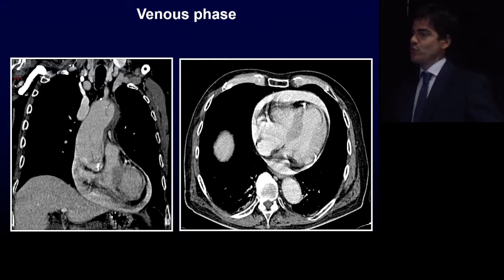just because I was reviewing pericardial disease, et cetera, and it came up that MR is, of course, not the technique for looking at pericardial tamponade. In this patient, we had this unfortunate event, and just to tell you the life of radiologists, there will be for sure legal implications related to the use of contrast in a type A aortic dissection. So we concluded with CT just to make a light and I would say shocking case.